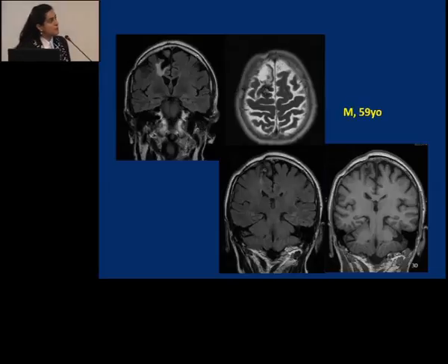This is an example of a close to 60-year-old man. This morning I was at the Martina workshop. So this is follow-up after neurosurgery. Do you think that they succeeded in removing this lesion?